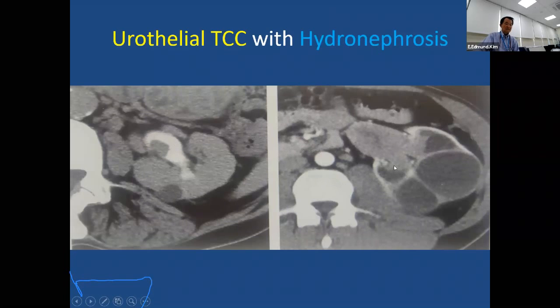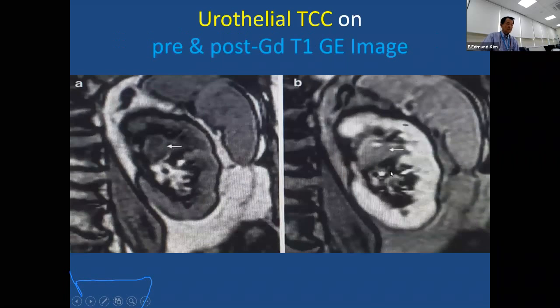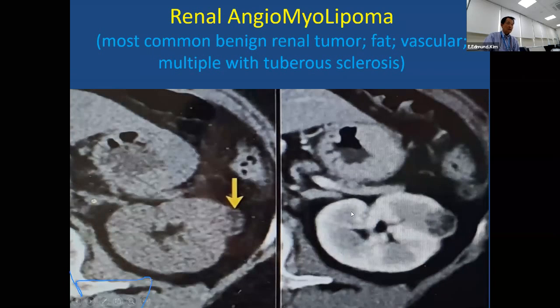The whole collecting system is dilated. And here, pre and post contrast, the renal pelvis enhances, eventually blocking the draining system.